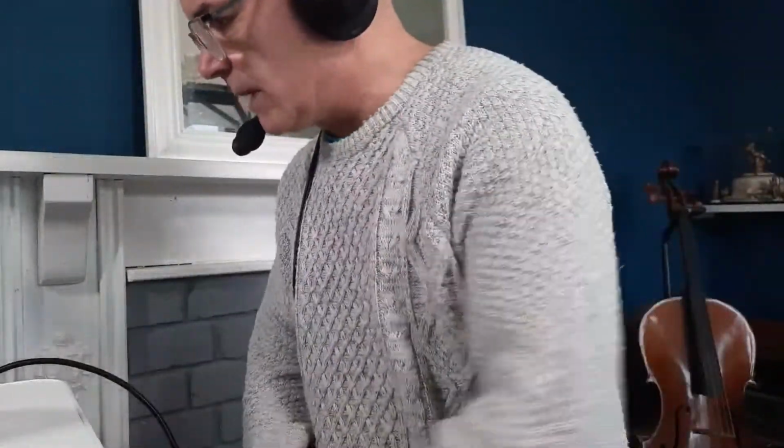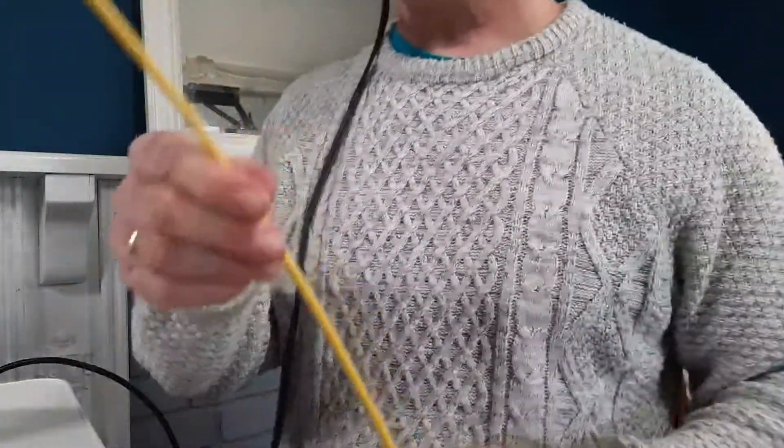Another piece of equipment that you may or may not need is this one here, and I'll switch to the webcam for this. So this is your Bougie. Your Bougie is a very useful piece of equipment. It's probably about 1 meter long, I would think, maybe a bit less.